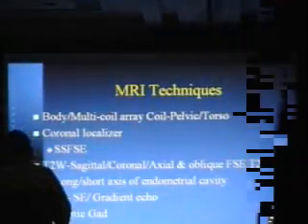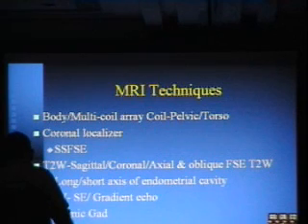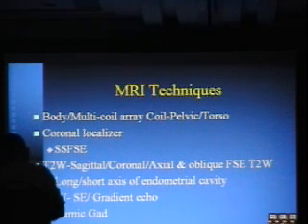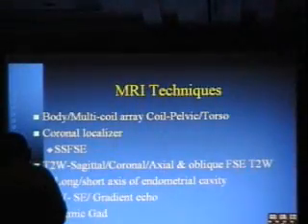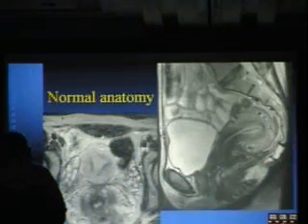We're doing lots of T2 images. A lot of multiplanar T2 is the key in the female pelvis, male pelvis. You want a lot of those. We're using more and more gadolinium, particularly in malignant diseases. We use it in the dynamic mode, same protocol as we use for the liver. So fat suppressed, gradient echo acquisition, start off with a non-contrast and then run it a couple of times afterwards, and so you get the multi-phase approach. We do some short axis views and oblique things when we're looking for congenital anomalies, but that's basically it, so it's a fairly straightforward protocol.